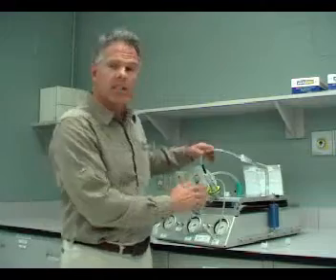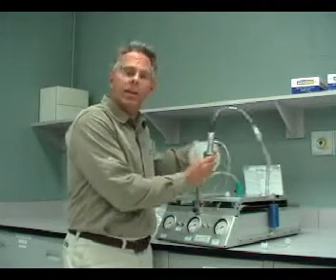Hello, my name is Alan Prost, and I'd like to demonstrate for you today the effects of compliance and resistance. To do this, I'm using a test lung and a manual bagging unit.